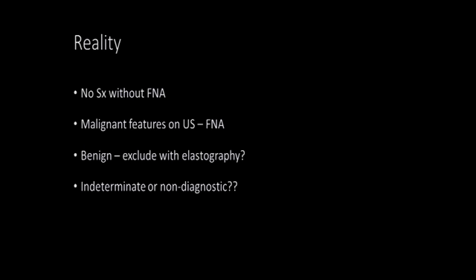So in reality, no surgery will be performed without fine needle aspiration. If malignant features are seen on ultrasound, fine needle aspiration would be performed for those lesions, and it may be more prudent to exclude benign lesions with elastography rather than trying to diagnose malignancy. And the question remains, what happens with indeterminate or non-diagnostic samples, in which case you might need elastography and fine needle aspiration to give complementary information.